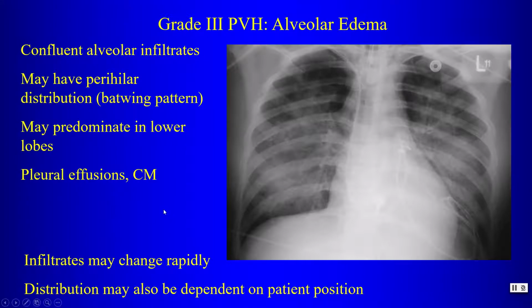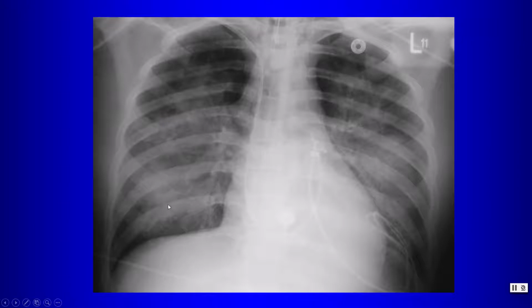With pulmonary edema, the consolidations may change rapidly, and the distribution may also be dependent on the patient's position.